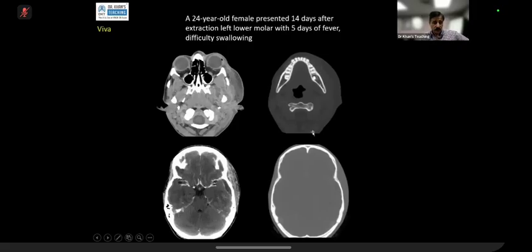This is the last case for today. Look at this, Yes, sir. and look at this as a post-contrast sequence. And, Yeah, and of course, there is post-contrast for brain. Over to you.